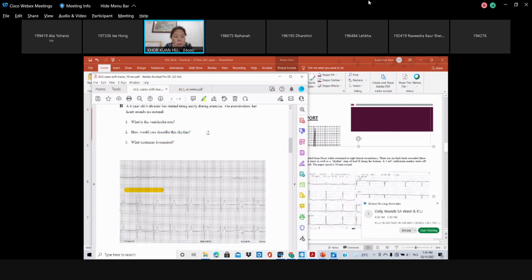Is there a P wave? Sorry, doctor, but if we shift it a bit, then it will be 60. But this one is the T wave. When you want to count the whole complex, you don't want half a complex and say, oh, this one is also calculated. You want the whole complex. So this one is not counted, this one cannot be counted. If you say it's not fair, you start with something where I can see one complex, okay, I will say okay.